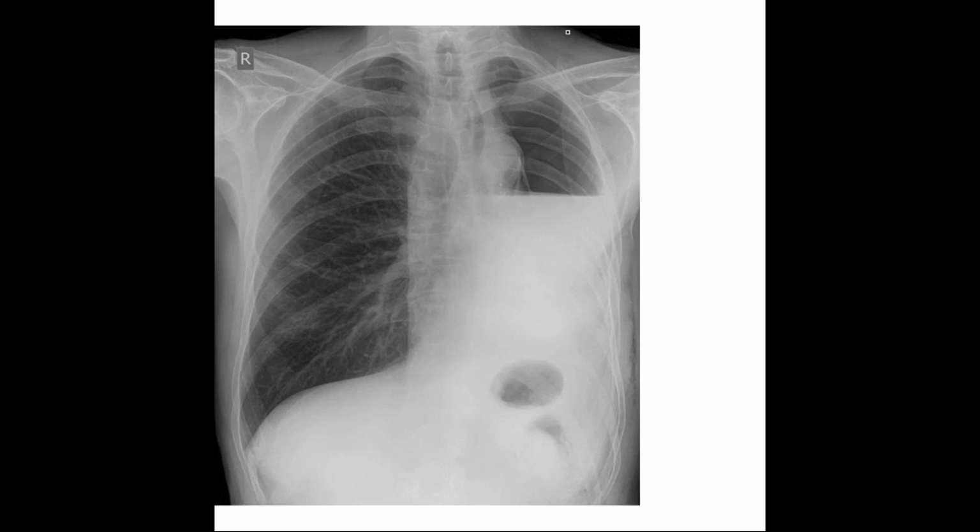I don't have the X-ray of BPF as well. Anyhow, no issues. So this is what we are finding in this X-ray. There is a pneumo, there is a hydropneumothorax with the collapse of the left lung. Etiologies you guys have mentioned: trauma can be one of the etiologies, infection, anaerobic infections, tuberculosis.